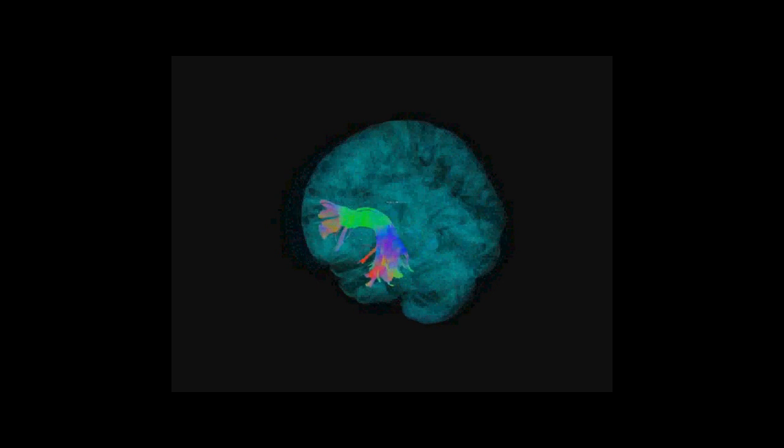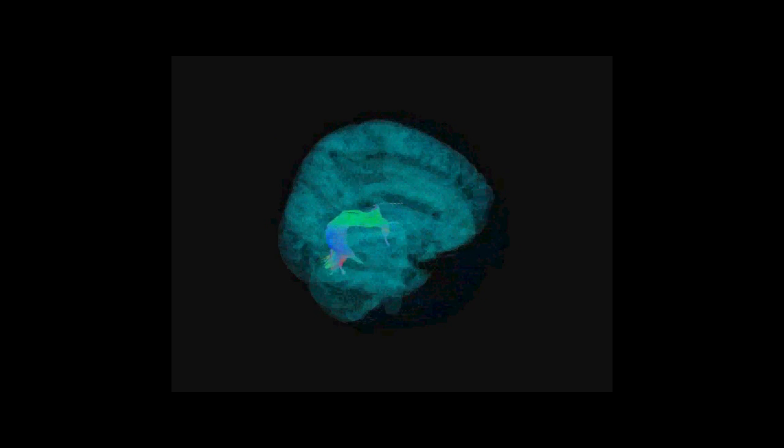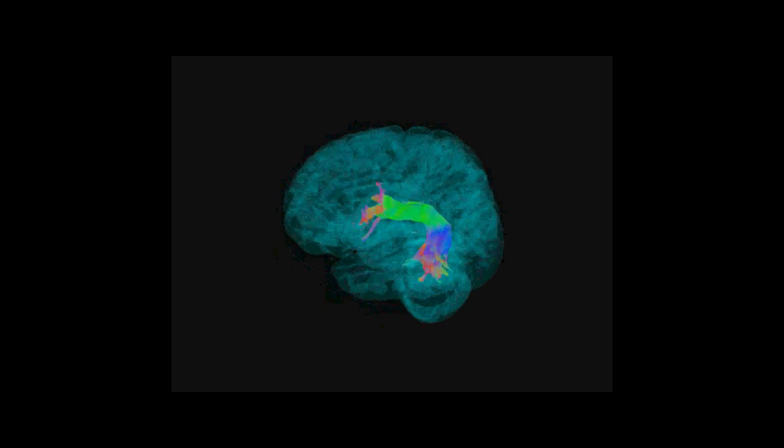This is the arcuate fasciculus growing. You can see the fibers expanding and the start points being generated as the fiber set expanded. Now we're shifting to a 3D rotation where you see the fibers poking through the cortical surface, and then we'll tip that to just sort of see the position of the fibers. This is an example of overexpansion of the fibers. So as the seed growth now goes over, you see other fiber tracks being brought into the mix of fibers identified.